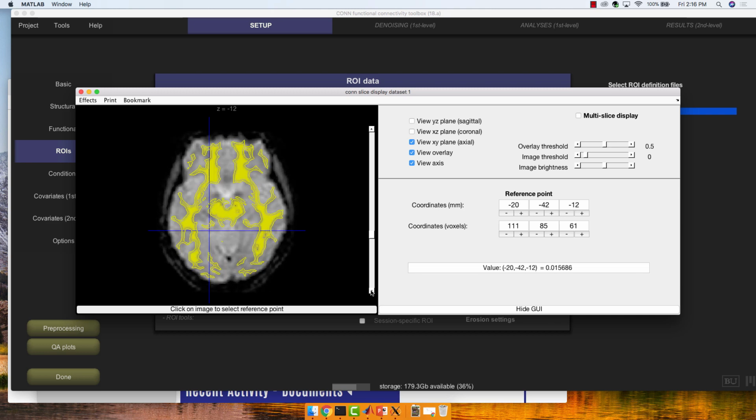Now, what do we do if this doesn't look good at all? What if we think that it failed completely? What I would do to address that is first check to make sure that the anatomical image, does the contrast look good? Is that something you can fix at the scanner? If not, I'll give you one recommendation. There's a command in AFNI, 3dUnifize. It's an outside tool, but this helps increase the contrast between gray matter and white matter. 3dUnifize, I believe. Let me check. Make sure I'm giving you the right name.